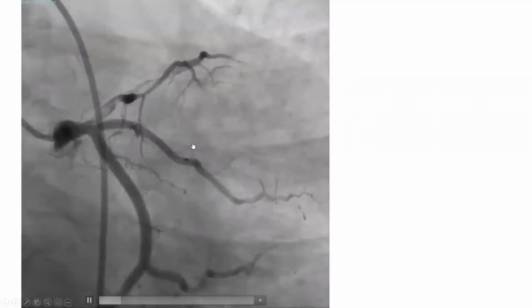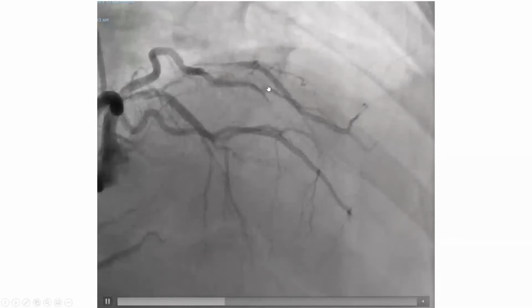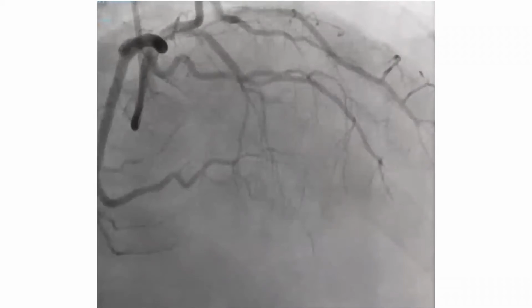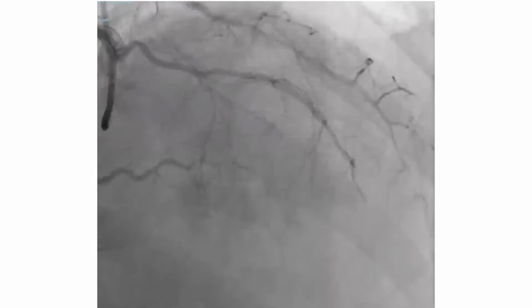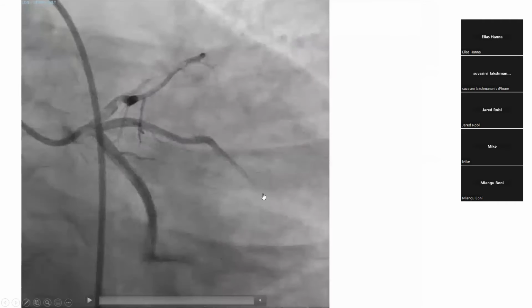Now, why is that important? Because when you think spontaneous coronary artery dissection and you have TIMI 2 flow, so the vessel is open. It has a slow flow, but it's open. Look at that LAD. It goes all the way distally. So when you think SCAD and you're having TIMI 2 to 3 flow, you should try not to intervene. SCAD, hemodynamically stable, TIMI 2 or 3, try not to intervene, because you can worsen it with your coronary intervention. So it's important to make the diagnosis. Conversely, if it is an atherothrombotic process, then you have to intervene as it is done traditionally in MI.